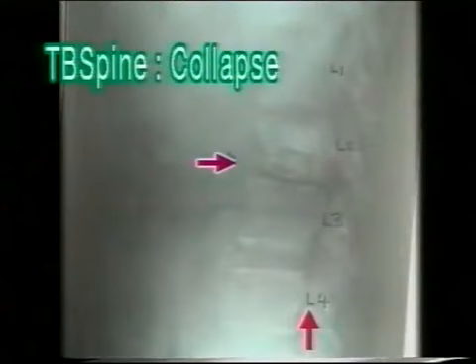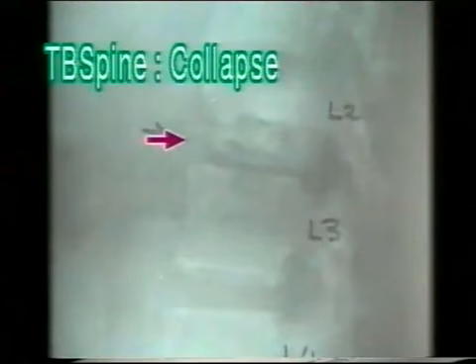In a later stage, the disease spreads in the vertebral body, causing destruction and collapse of the vertebral body. The disease is always more extensive in the anterior part of the body and results in anterior wedging and gibbous formation. Note the destruction of the body of the second lumbar vertebra with reduction of the L2-3 joint space.